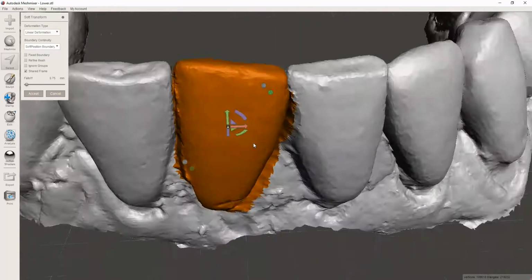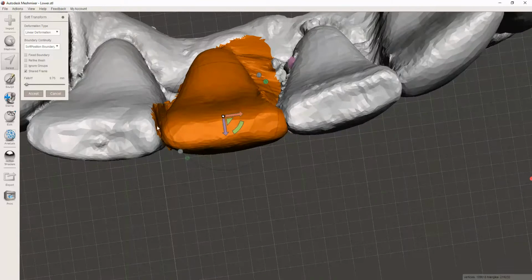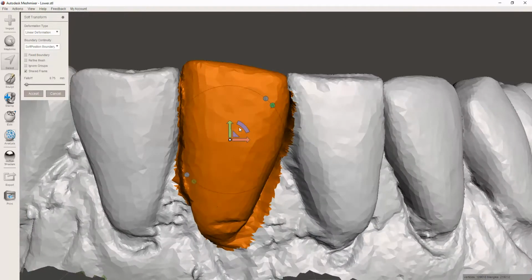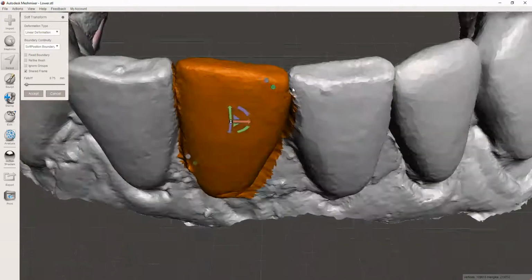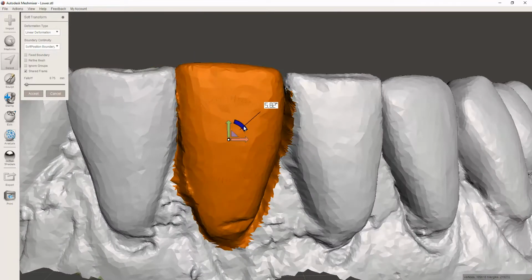I'm going to show you something that's kind of important to know in a minute. I look like I'm pretty close. I actually would go a little more this direction, but the reason I'm not is look how far the root's moved. That's not going to happen with this tooth, but based on the tip of it, when you start to rotate it in that direction, it sort of sweeps the root out in a way. So we need to bring the root fairly close to its original position, sort of bisecting the fall off on either side.